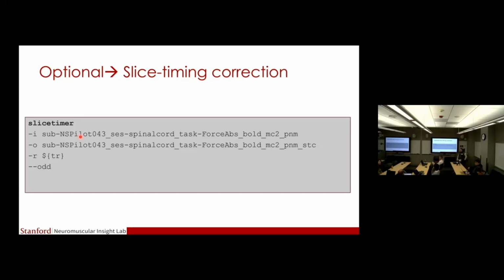At least in the brain, we've seen weird effects if you do slice timing correction and its interaction with motion realignment. That can also be true. It can be tricky, because it's a bit like the chicken and the egg, right? You should ideally do them at the same time, but there is no algorithm to do it at the same time. And with the brain, you're doing 3D motion correction. Here we're not; we're just doing 2D, which also makes it kind of tricky.